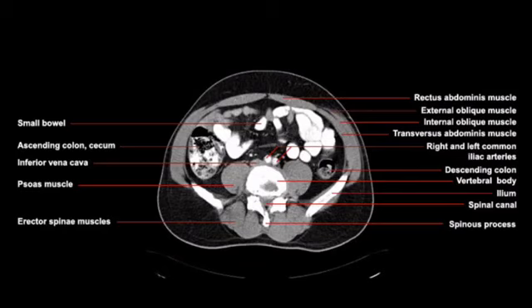Thanks for listening. That was an overview of CT abdominal imaging, looking at the abdominal cavity and the axial plane.